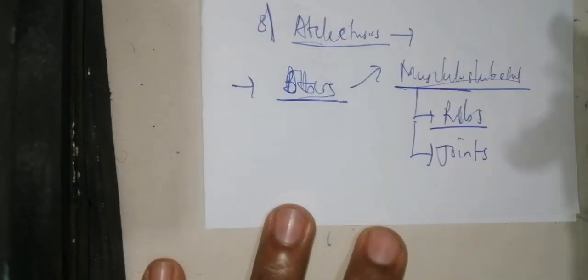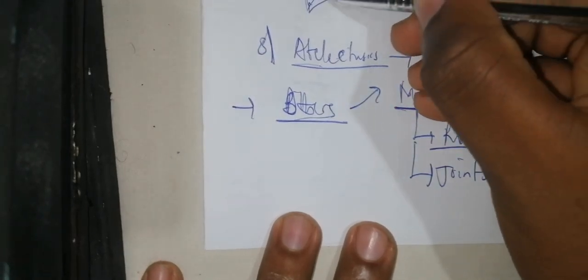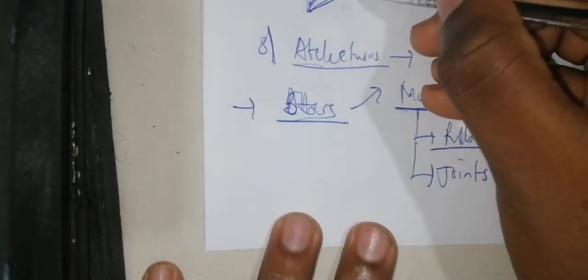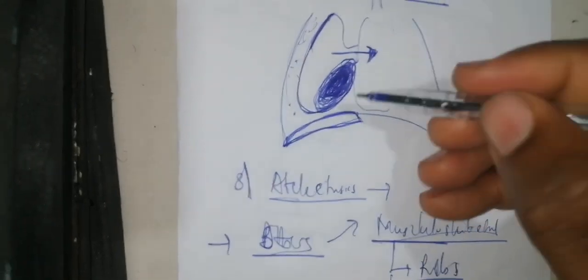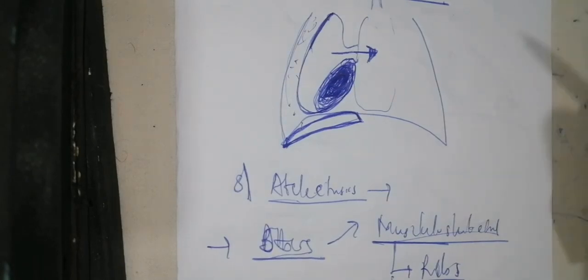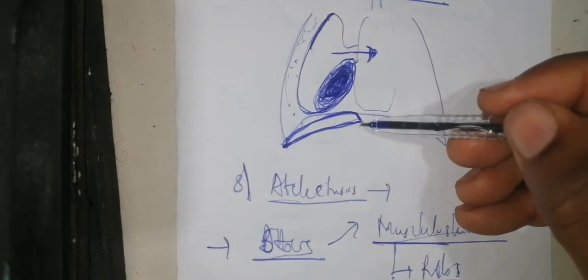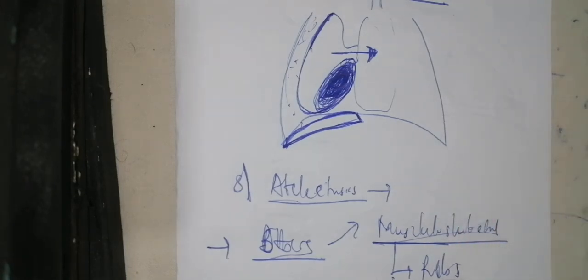And on the X-ray also, you have to look underneath the right hemidiaphragm to know if there is a crescent air shape. Is it clear? When you look underneath the right hemidiaphragm to see if there is a crescent air shape, that crescent edge is going to tell you that there is a perforation. Is it clear? It tells you that there is perforation of the bowels. Is it clear? If you see a crescent edge shape underneath the diaphragm, that's a crescent lucency underneath the hemidiaphragm. Is it clear? So those are the different elements that you need to understand on chest X-ray.